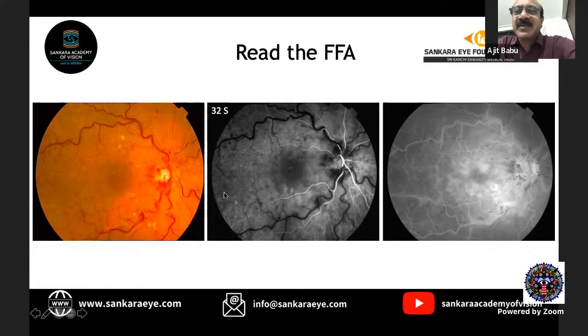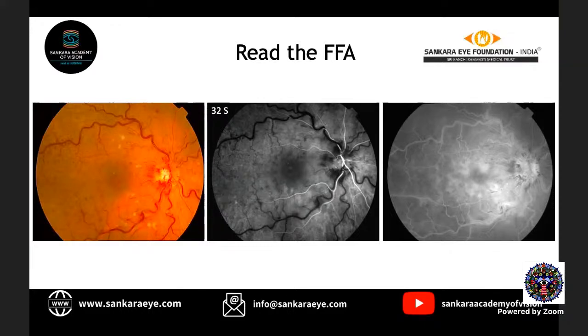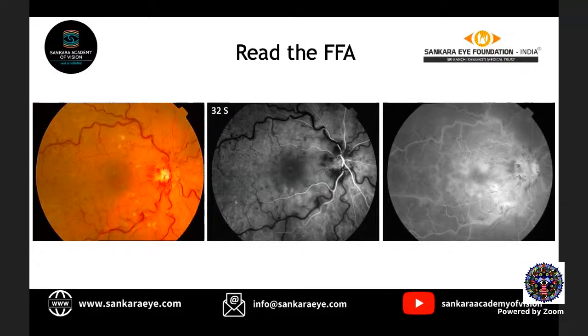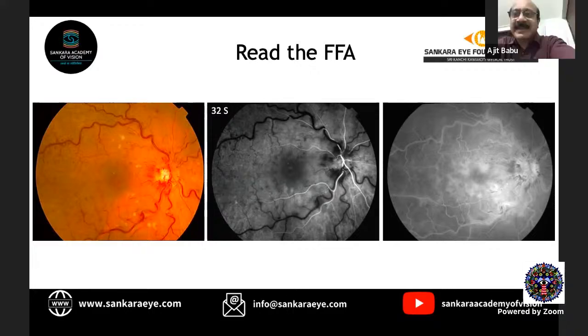You just described it. You are right, only you require a little bit of clinical application. You are in the arterial phase, whereas the timing shows it should have been in the recirculation phase. So there is a significant delay in the passage of the dye.